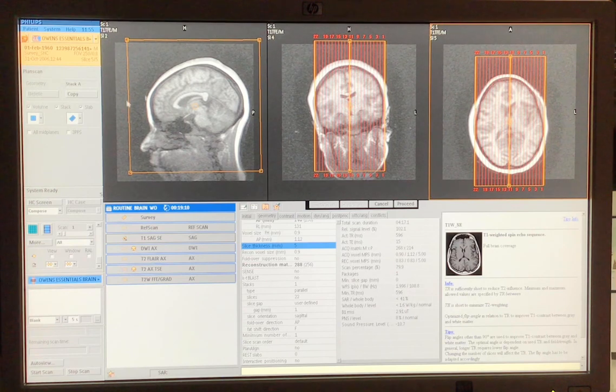Now, if you go over to where it says your lines here, I can turn off, these are all of my individual slices. Notice it says 1 through 22, and the 1 I'm starting on the left side and I'm slicing through to the right.